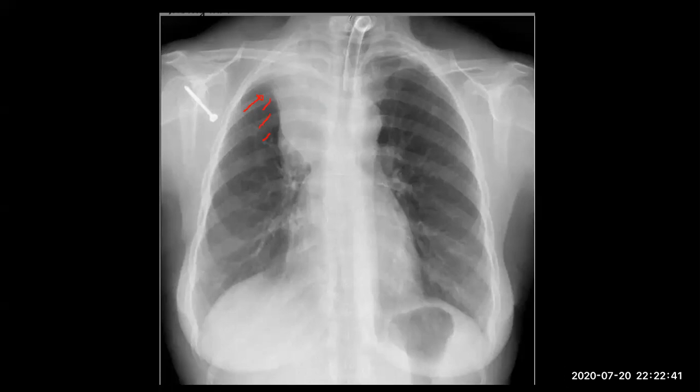This is caused by bulging of the fissure. This is because there is retraction, not bulging. Bulging is outward, but this is retraction, because there is loss, so there is retraction of the fissure. And the lower part is caused by the tumor, and this is the tumor here.